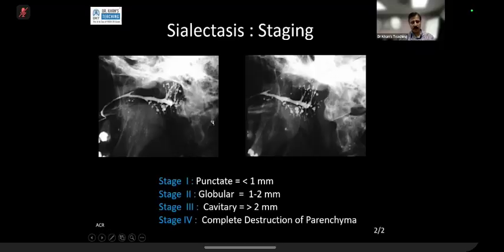Okay, can you tackle this, please? Yes, sir. I'm provided with spot images from a parotid sialogram, and what I can see is multiple dilatations of the branching ducts. However, I cannot see any filling defect in either of them. So, likely representing sialectasis, parotid sialectasis. So what will be the cause for this? It's due to autoimmune parotitis. Okay, fine, well done. I will take over.